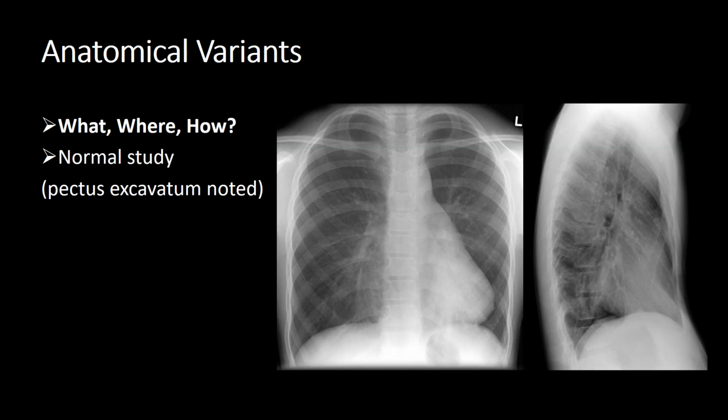So what, where and how? Normal study, pectus excavatum noted.